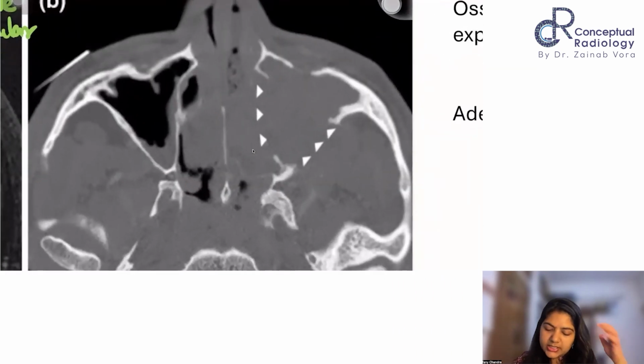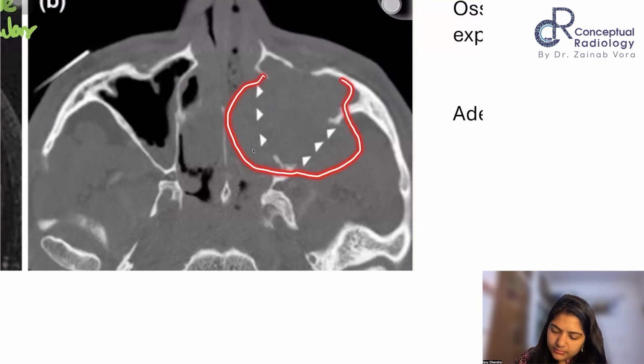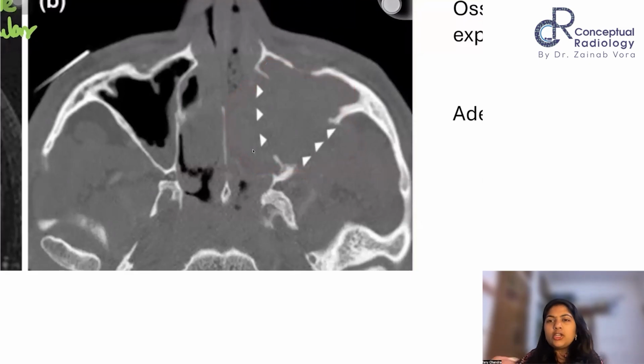Can you see on CT? These are some arrow marks. There's no bone here. It's gone, completely gone. Right? So these are not pressure erosions. You can also see the outline of the mass here. Right? So these are not pressure erosions because your mass is extending beyond the bony outline. Here, whatever bone was in these places has all been eaten away. Right? And I'll show you another finding here on CT.